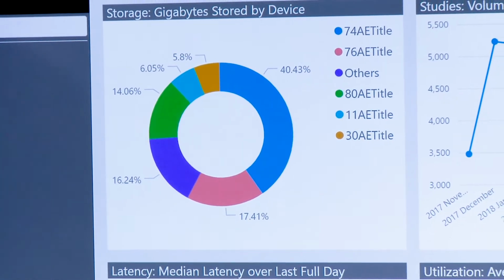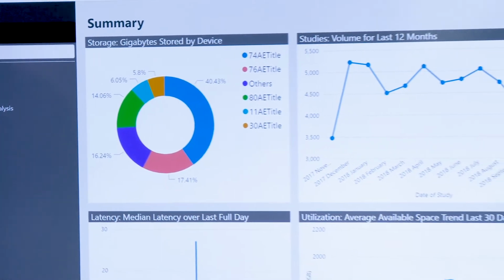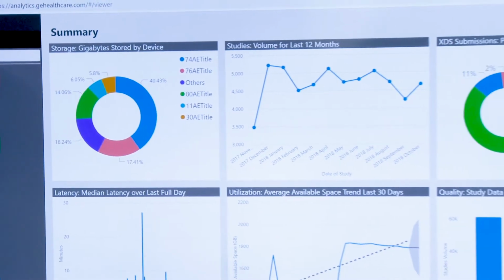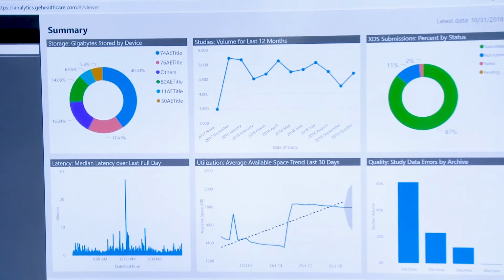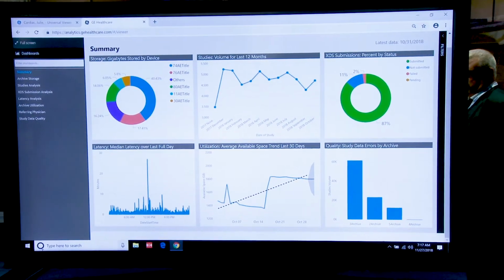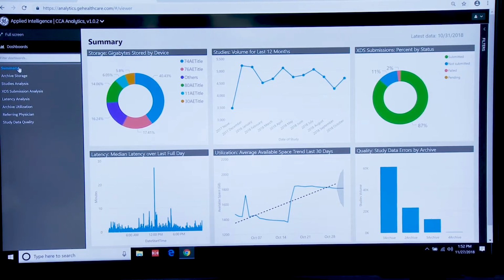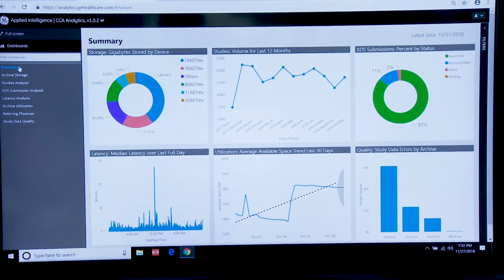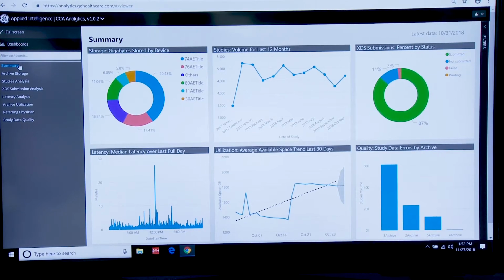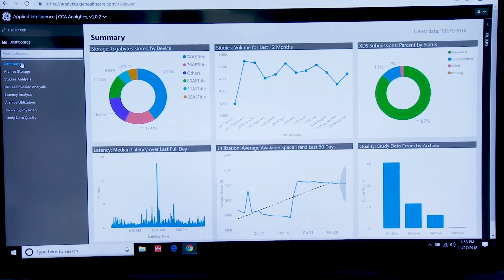Within the summary panel, it allows us to very specifically look at all of the data as it comes in from each of the different modalities and imaging sources, including not just DICOM or departmental archives like cardiology and radiology, but also looking across the enterprise at visible light, video, scans, and other data captured that are considered images and held in the vendor-neutral archive.